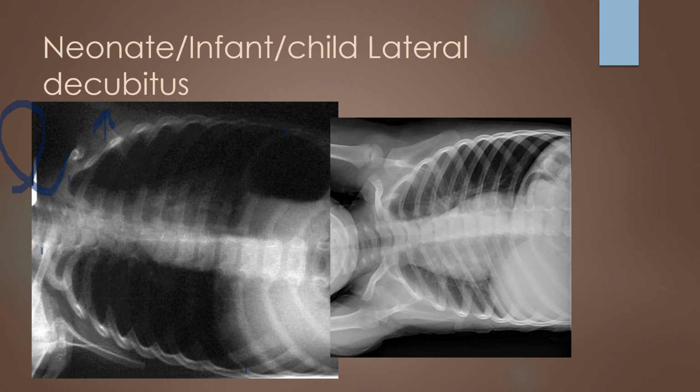The other thing I'm seeing is a lot of quantum mottle telling me I don't have enough mAs. So on both respects, I am very, very low in my technique. I assumed that the EI values on this would be very low, and so I would need to follow those EI values to make substantive changes to get me to a target EI range. If we look at the more specific, this is definitely going to be repeatable, but I don't want to repeat it until I know if there's something else that needs to be changed too.